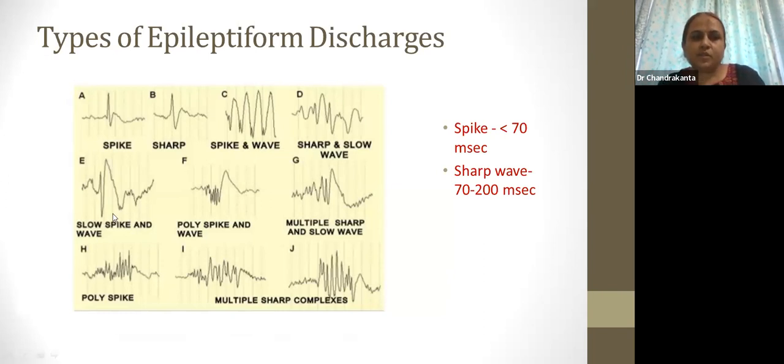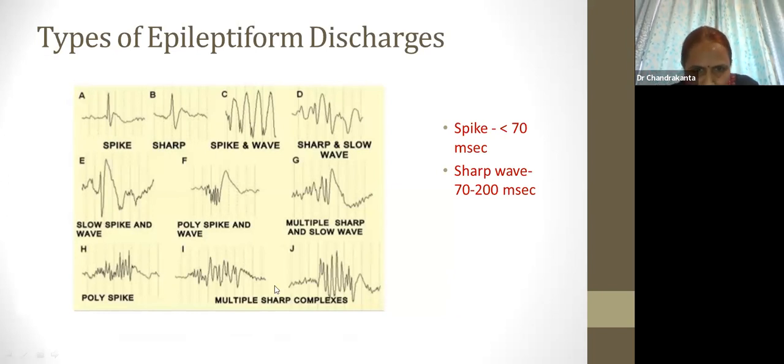In EEG, if you see, there are two types of vertical lines. There are dark lines and in between there are faint lines. This is 1 second and one small area is equivalent to 200 millisecond.